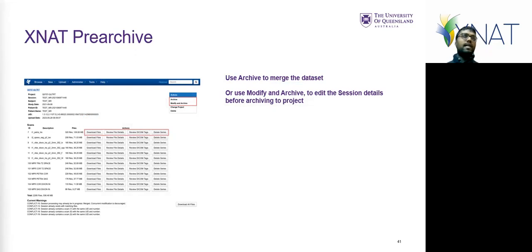If the new data set you actually wanted named differently, or it's actually a different session, you can rename it and resend it via here. That way it'll be kept separate from the one that's existing on the server.